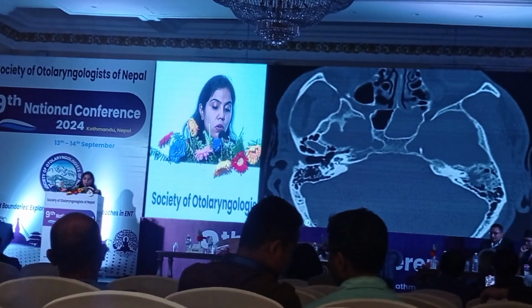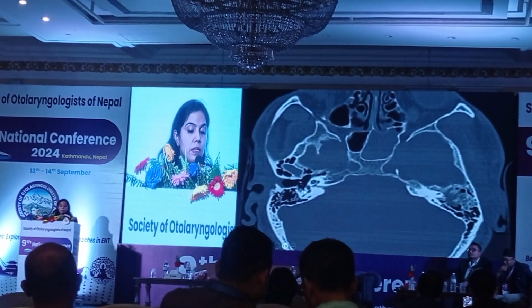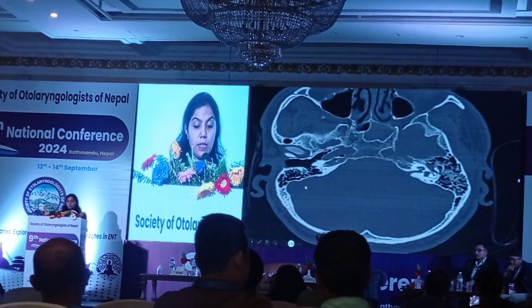So this is the cochlea and this will be my round window, and this is my pyramid. This will be my infrapyramidal recess which is sinus tympani, and this is my facial recess.